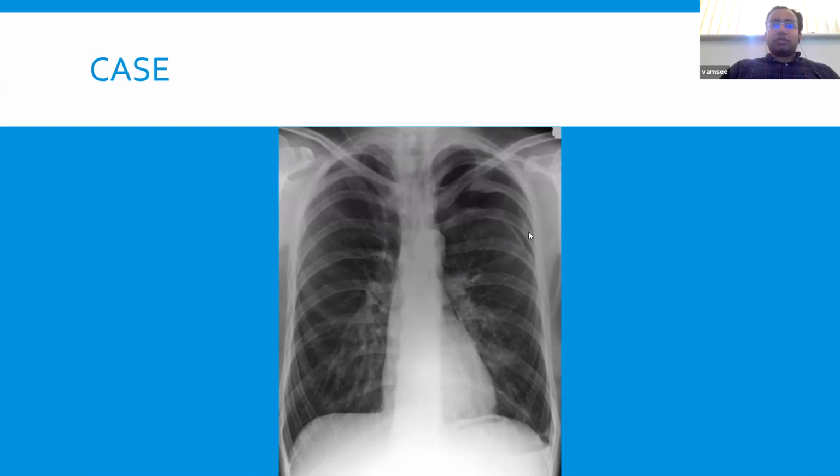Okay, let's give that a few more seconds. And then, I mean, most of these cases, yes, I would probably say that, yeah. Flattened diaphragm. You can still make out a good costophrenic angle. Actually, if anything, there's maybe slight blunting on the left, but on the right, you've got a good costophrenic angle there. There's something else that I just want to focus on.